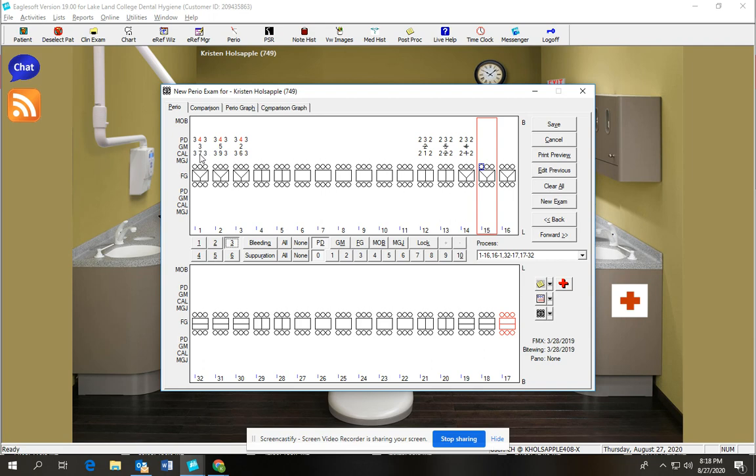So that's actually 7 millimeters lost. Over here, when you see the pocket depth, it is showing that there was a 3, but the gingival margin, the overgrowth, was a -2, so it takes that into consideration, and now you actually just have 1 millimeter of loss. Okay, so it takes it into consideration, and it does the appropriate clinical attachment loss.